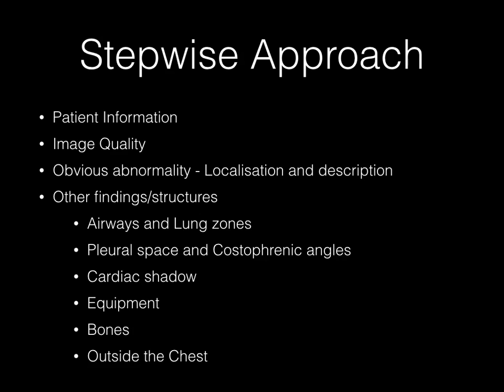Make sure that you have looked outside the chest, including subcutaneous spaces, bony shadows, as well as neck swellings, and sometimes fracture of the humerus. Sometimes that can be missed as well.